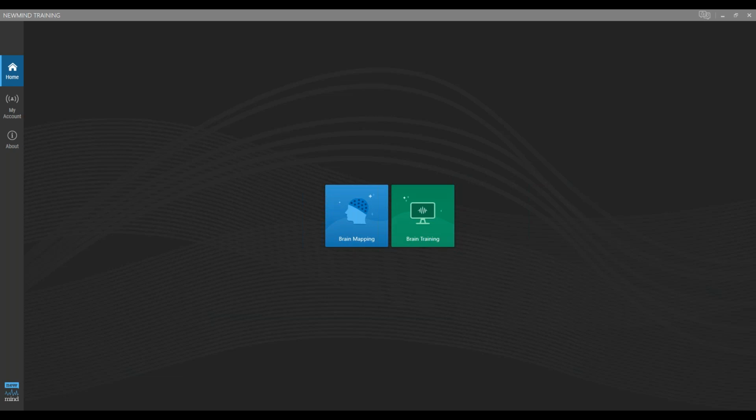And the fact that training efficiency is staying up is telling you that in between those events of artifact, they're actually training well. Because again, our software ignores all the data when artifact is occurring. So it's not tracking amplitude of the signals, it's not tracking asymmetry. Of course, all the thresholds are paused. Therefore, there is no data being fed into all those numbers at the bottom of the screen.